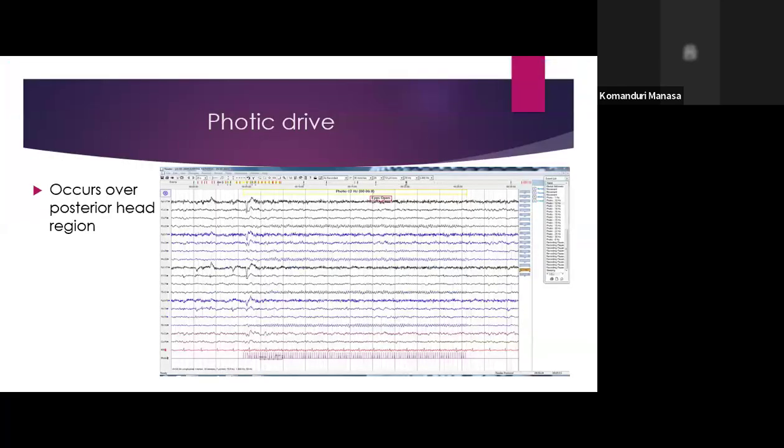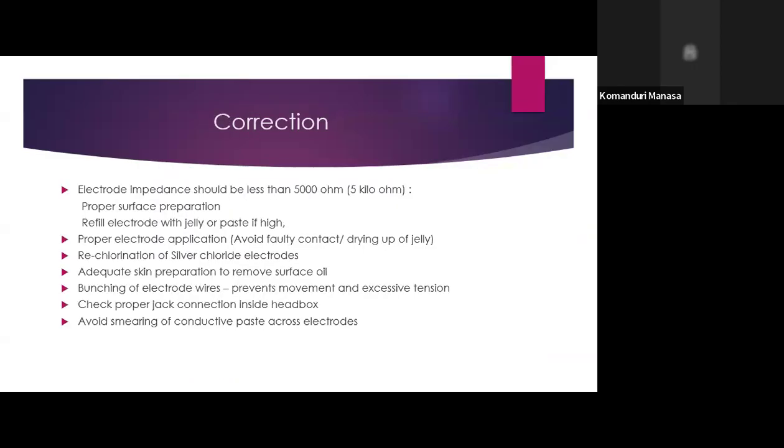Versus the photic drive, which is also seen in intermittent photic stimulation. This is not an artifact. It is a physiological phenomenon. It occurs over the posterior head region because of occipital lobe activity.